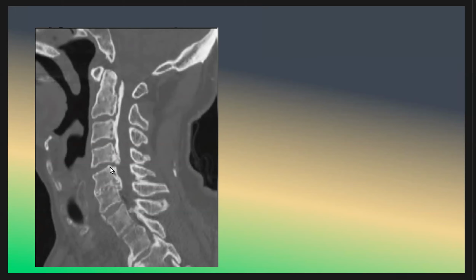And also we have a fusion of this vertebra and this vertebra, 2, 3, 4, 5, 6, and possible fusion in the 6, 7 also. It can be associated with DISH in some percentage. I don't remember, but I think it is about 30%.